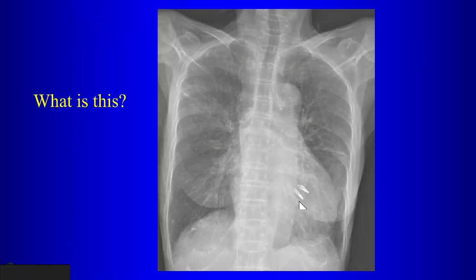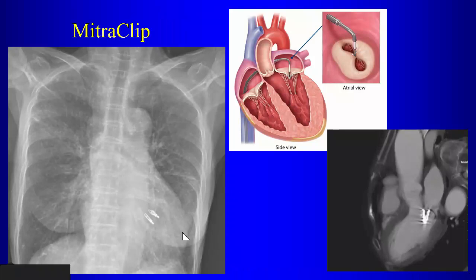Okay. What about these guys? Have you seen these before? This is something we've started to see in the last few years. Any idea? Like the mitral clips? Those are mitral clips. Yeah, right. So how do these work?